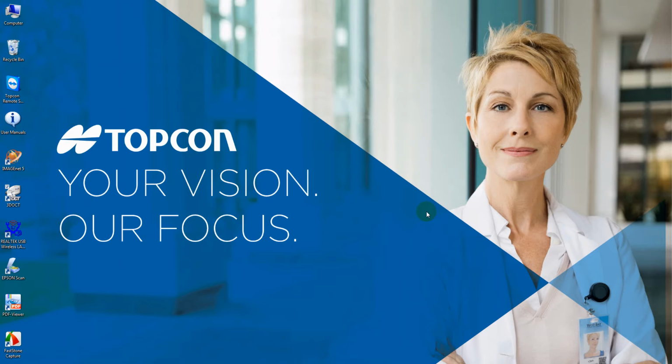to work the software. So this is after you take the image. Once you've learned how to take the image, which is very easy by the way, it's basically all automatic. I call it goof-proof picture perfect because it almost is. You can't really goof it up.